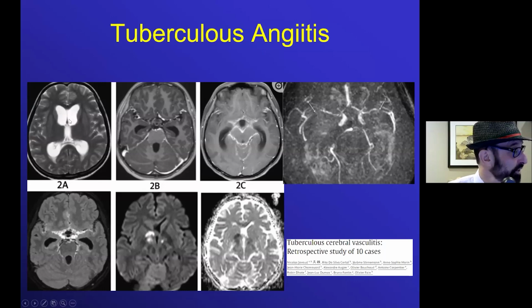Here's a patient who has the meningitis with TB showing communicating hydrocephalus with gumming up of the subarachnoid space and the CSF production and resorption, but also showing the enhancement all around the circle of Willis as well as in the interpeduncular cistern by virtue of that vasculitis.